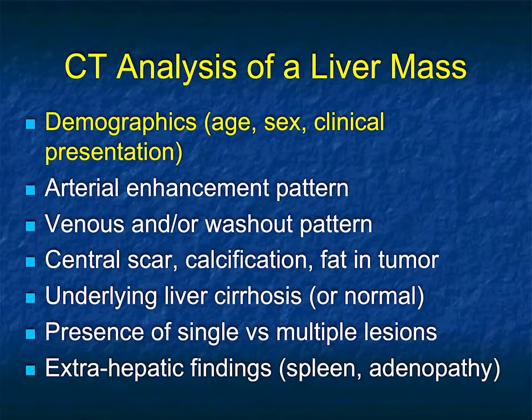Now, we look at the scan. Most people, including ourselves, do not routinely get non-contrast CT. In the old days, non-contrast CT was obtained, though it wasn't really clear what it was obtained for. We still would do a non-contrast CT if we were looking at a focal hepatic lesion and trying to look at its sequence from non-contrast to arterial to venous and delayed.